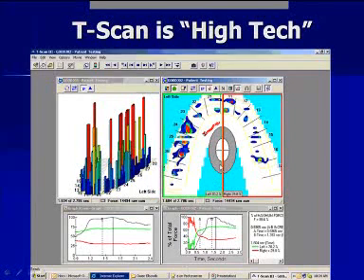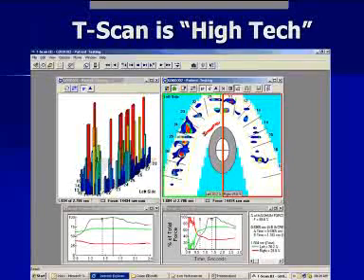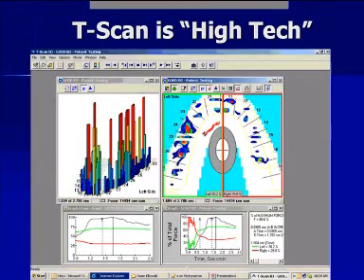Adults see this. 70-30, it's not balanced. If you ever have any engineer patients, and engineers love this software because it makes sense to them. And this is how we can get the patients to totally commit to the treatment. In this particular case, it was an orthodontic case, but it's not always an orthodontic case. It might be an equilibration case where we can get more forces occurring on the right side.